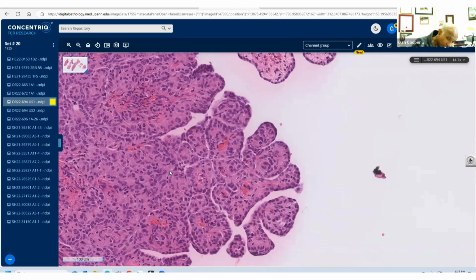So Carla is suggesting a mesothelioma, and she's putting it into the papillary mesothelioma category, which is now changed. And if you look at the WHO, it's now called tumor. She's absolutely correct. Now, those are called well-differentiated papillary mesothelial tumors, right? Not mesothelioma, but mesothelial tumors. Those are usually well circumscribed. They're usually about 1 to 2 centimeters, very well differentiated.